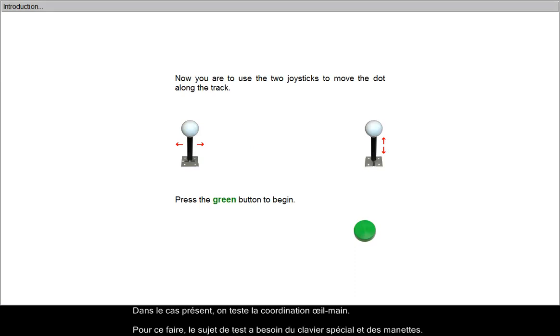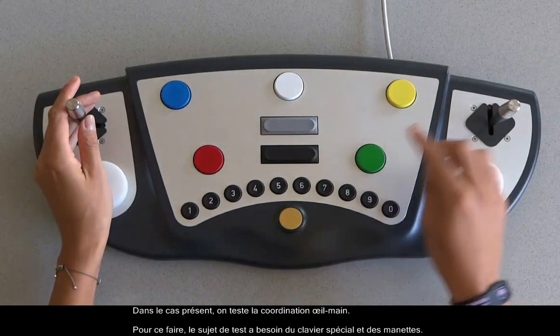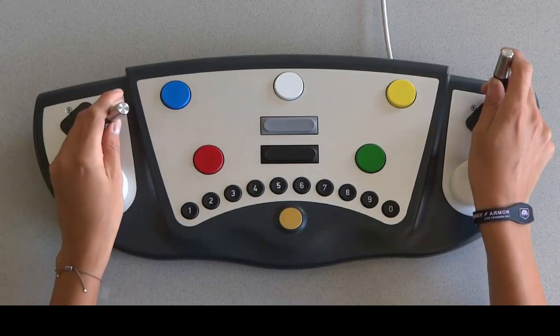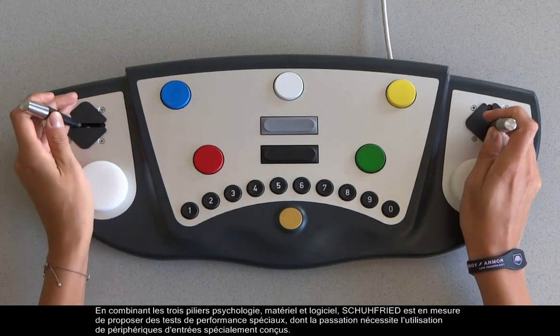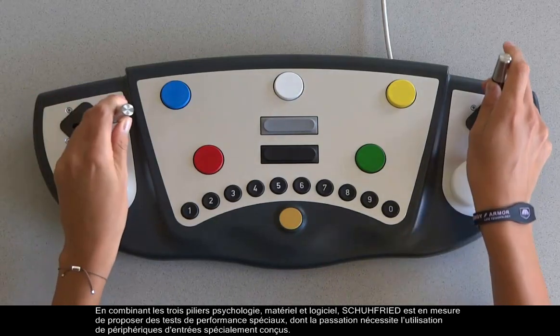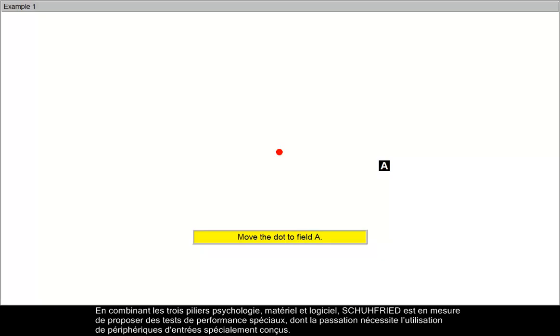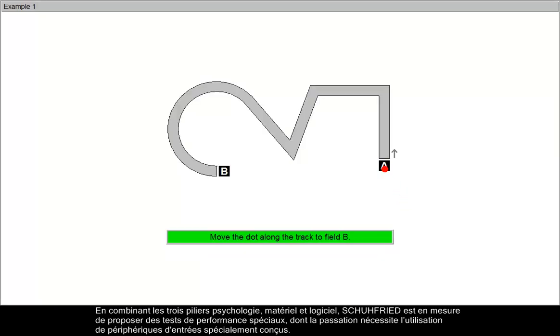Here, eye-hand coordination is being tested. For this, the client needs the special response panel with the joysticks. The unique combination of the 3 pillars of psychology, hardware and software enables Schuhfried to offer a wide range of special ability tests that require specially developed input devices and peripherals.